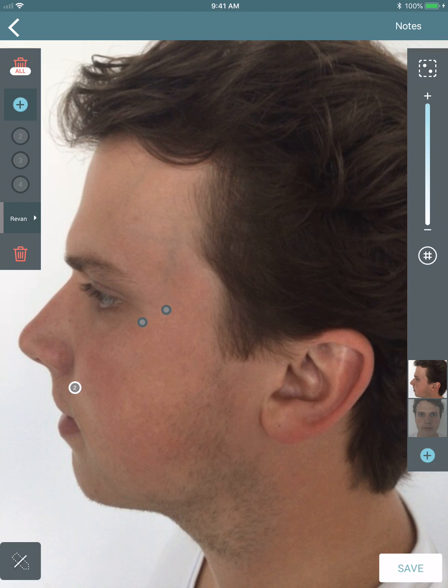Now when I click save, and this is brought up in our injection history, we have 2.5 cc's. That's right. And as we discovered in previous videos, we can navigate this back and forth in the history.